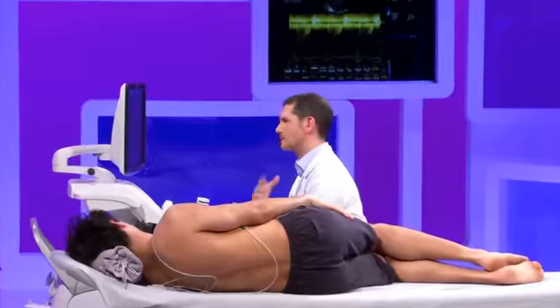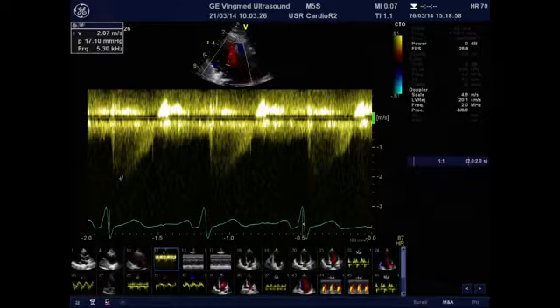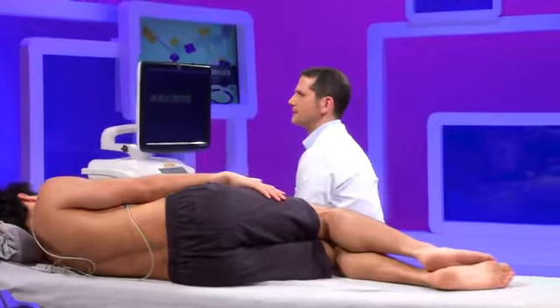So I would say that we need to combine all the information. We start by looking at the heart structure. We assess left ventricular ejection fraction to know how to use our parameters. Importantly, we assess left ventricular mass by measuring the wall thickness and the cavity diameter of the left ventricle. Very importantly, we assess the size of the left atrium by measuring left atrial volume and indexing the measurement to body surface area. And then we move to the parameters acquired by Doppler.